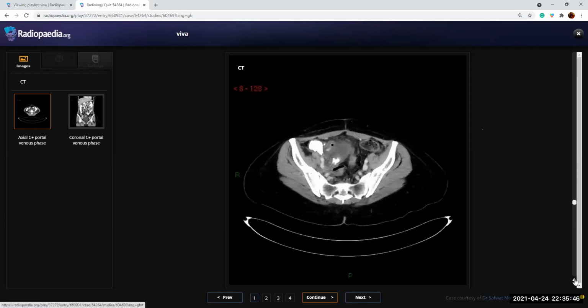By checking the sacroiliac joints, of course, I will need to check the bone window if there is evidence of sacroiliitis. There is some narrowing of the joint spaces bilaterally, but a bone window will confirm this.